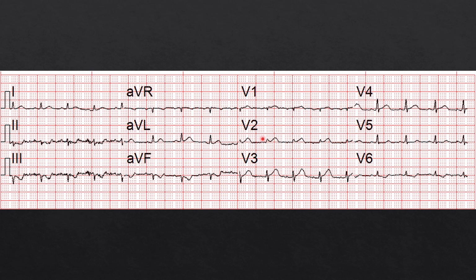But if you come over here, we see some problems, right? Not only is our T wave bigger than our QRS complex, but we're also getting that straightened ST segment. If we look up here, we're getting more of the same. So this could be an early warning sign, and especially in this patient presentation, it is very concerning for an acute early OMI or STEMI. This patient did go on to have a 100% LAD occlusion. This was that initial ECG.